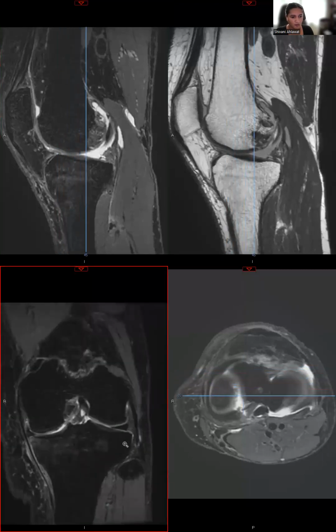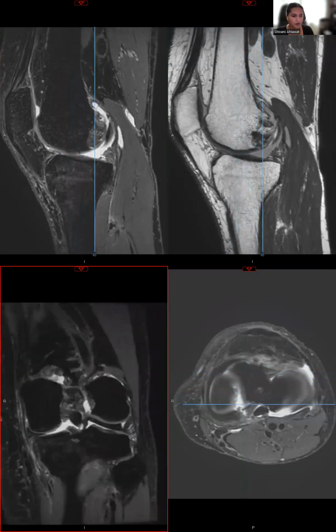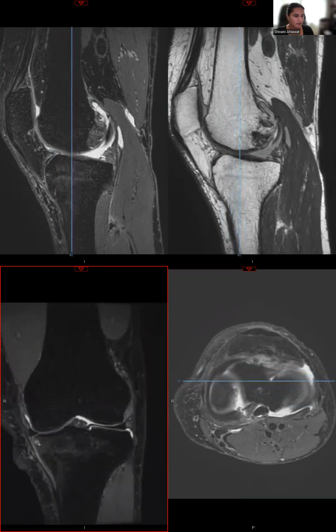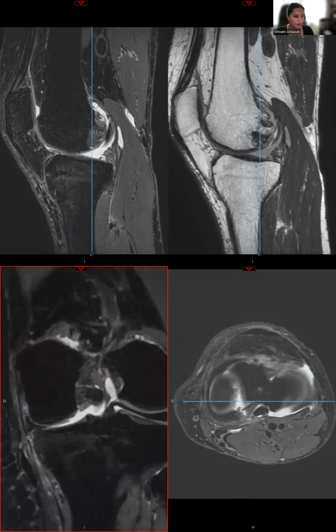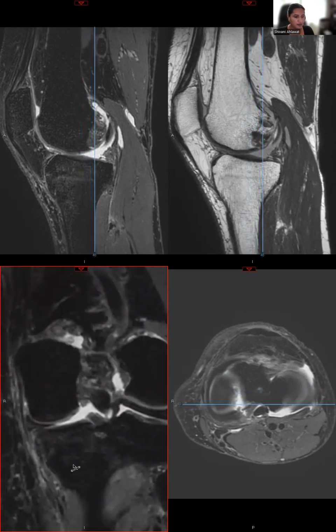So here is another example of a normal lateral meniscus. It has hypointense signal on all sequences, triangular morphology, and we can see the anterior root, horn, body, posterior horn, and root attachment. Now, when looking at the medial meniscus, we see the anterior horn, body, and we see that the meniscus is sticking out beyond the edge of the tibia by 3 millimeters. So there's extrusion, and that's a secondary sign supportive of meniscal tears. We also see subchondral bone marrow edema in the tibial plateau due to meniscosteochondral unit dysfunction, a secondary sign supporting presence of a medial meniscus tear.